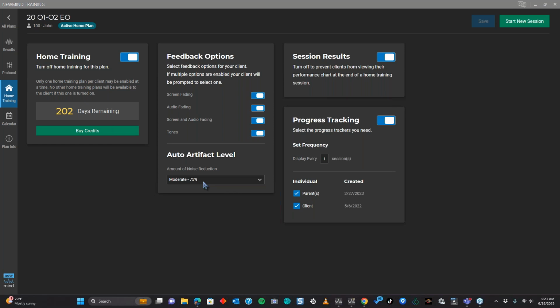If I was a technician working with that client, I would probably get linked up with them with something like TeamViewer or Zoom, turn on their camera on the computer and say, okay, let me see where your sensors are. Show me the amplifier, make sure everything's connected correctly first, and then go from there.